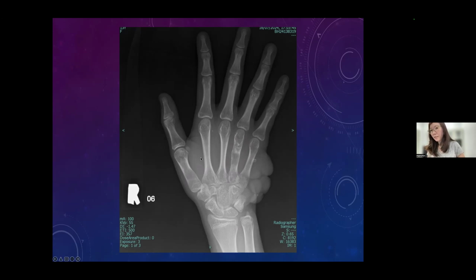Also another one at the first metacarpal bone here. It's very subtle, but when you compare the first metacarpal with the second and third metacarpal, then you will find it looks different, right? This is an expansile lytic lesion, but the cortex is still preserved, so it's a non-aggressive lesion. So the constellation of these findings will be soft tissue hemangioma and enchondroma, it comes out to be a Maffucci syndrome.